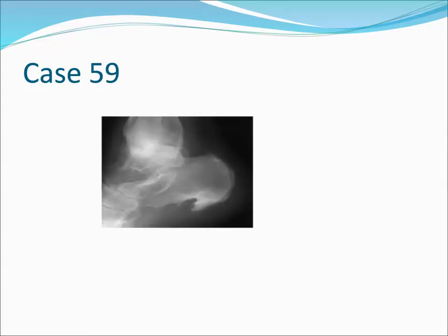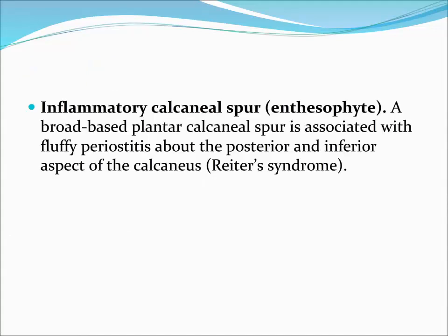Inflammatory calcaneal spur. A broad-based plantar calcaneal spur is associated with fluffy periostitis about the posterior and inferior aspect of the calcaneus, Reiter's syndrome.